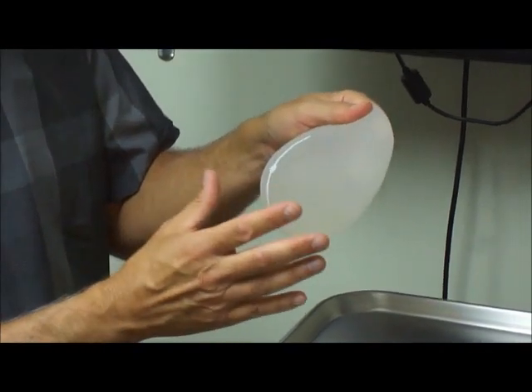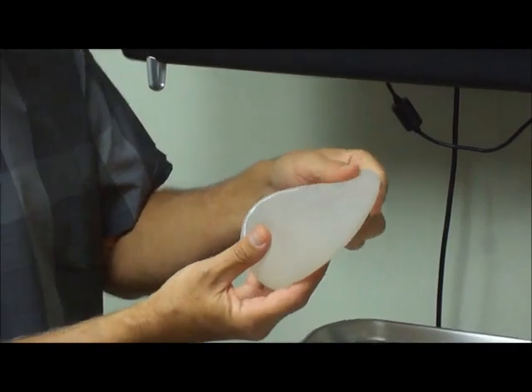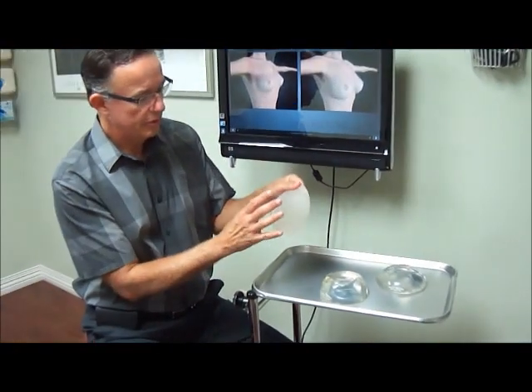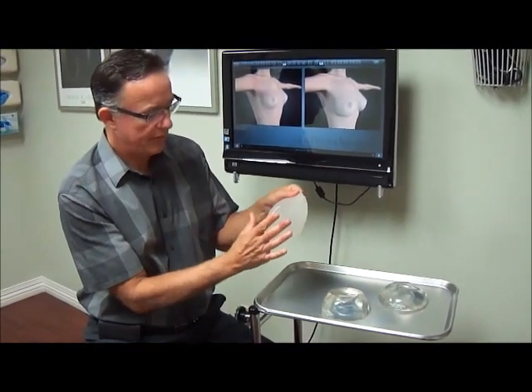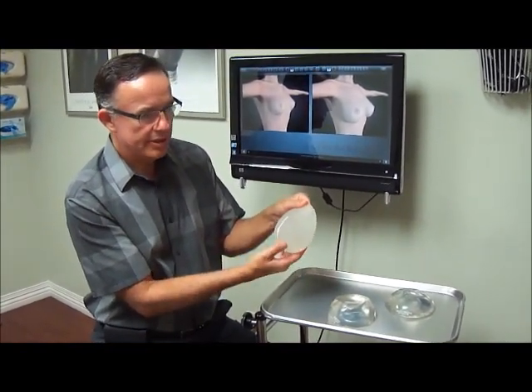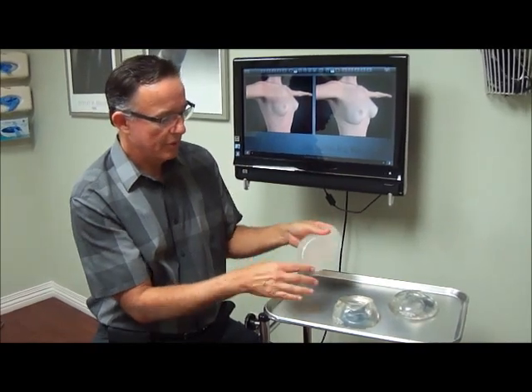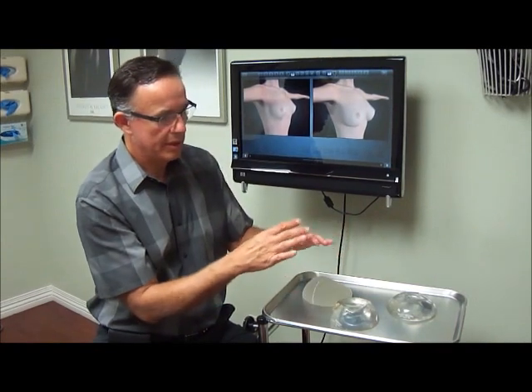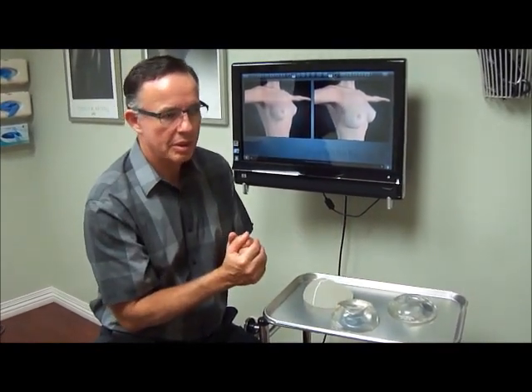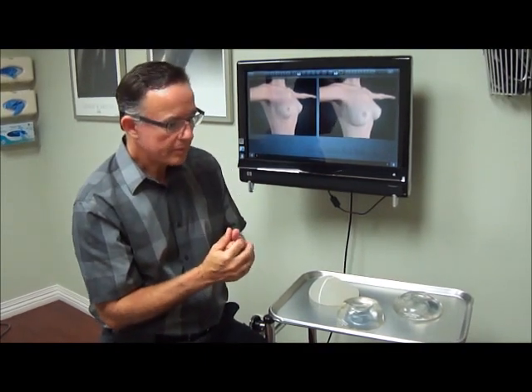Also, this kind of implant is much more challenging in terms of positioning because you want to position them in a pocket or space that is fairly tight, and it's just designed to fit the implant and not much else. Whereas with these other implants, you can get away with a less exact or precise pocket, and you will get a good result anyways.